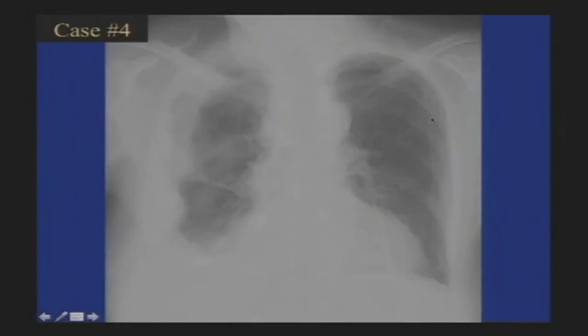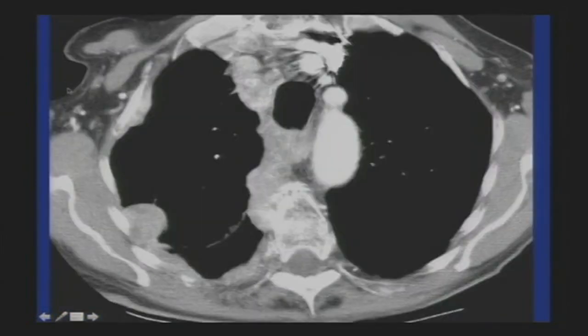All right, what else do we have here? Nearing the end. Nice example of circumferential thickening on chest x-ray. Circumferential nodular areas of pleural thickening. If you wanted to measure this, you'd be well above 1 centimeter. So that rule suggests that this is very likely going to be a malignant process. There's the CT scan, just confirming lots of mediastinal pleural involvement, greater than 1 centimeter, nodular.